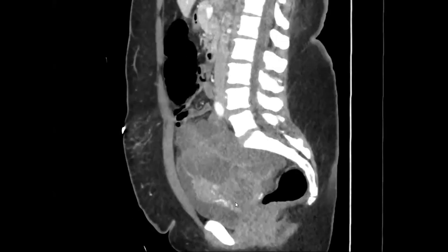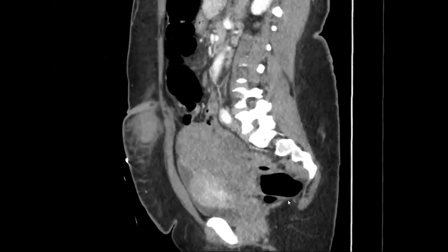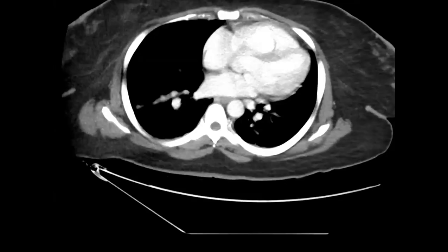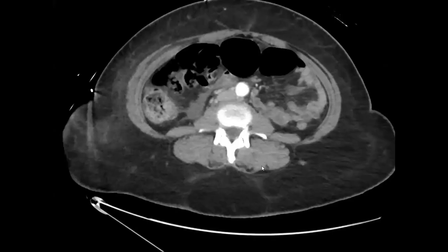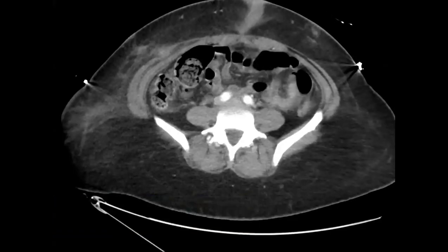Okay, so you've said fibroids, you've said abscess, you said it could be an ovarian mass. Okay, good. Excellent. And ascites can be from peritoneal carcinomatosis or post-op. I don't know if we have priors, but okay, I'm going to show you the MR.